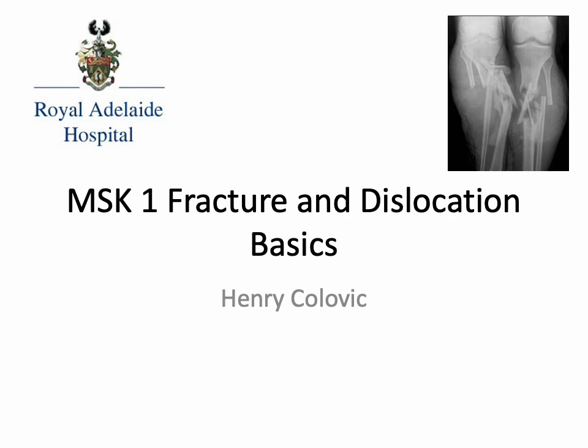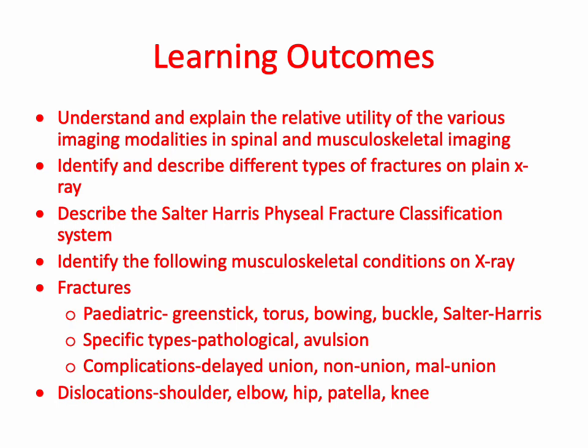Today we're going to be talking about the basics of describing fractures and dislocations, and we'll go through a few examples as well. So the aim by the end of today is to be able to describe a fracture.